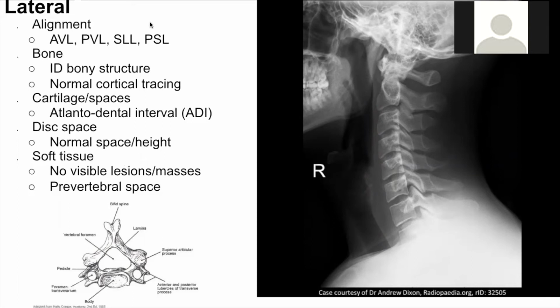Do you have anything to add, Max? I just want to see if you wouldn't mind going over how you identify the odontoid process and the anterior arch of the atlas one more time, just so that everybody can really get that in their brains, because I think it's a dense part of the image. Yeah. If they don't have practice reading it, it can be a little tough, but I think it's interesting and it's relevant to be able to see it.